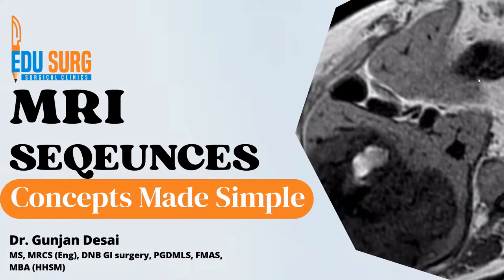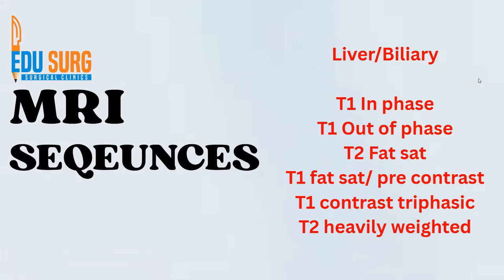In this video, we are going to see the various sequences that you will commonly see, with an example of the MRI liver and biliary protocol. So T1 in phase and out of phase, T2 fat saturated, T1 fat sat or pre-contrast. Then you have the images of arterial, venous, delayed and parenchymal phases. And then you have MRCP if you have requested.